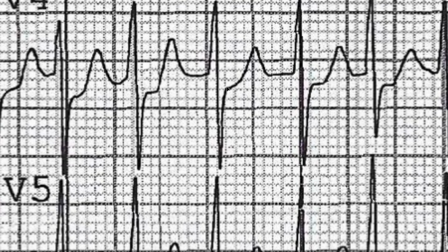And then you have this depression here, roughly 2 boxes. Well, a little over 1 box. 1 box is a good guideline. It's a good rule, actually, to have. So anything bigger than a box is an issue. But oftentimes I will react to things that are even half a box. But that's a different lesson.